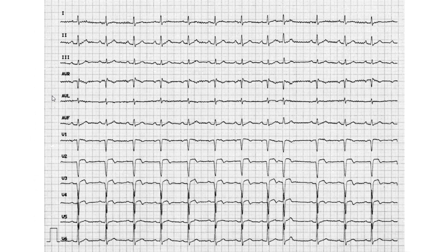So starting off, first ECG. What is the problem here? That is my question for you. Go through the points and come back. In the seminar, I'd normally give like 10 seconds, but you guys can pause for a bit longer, and when you're ready, you can just play the video.